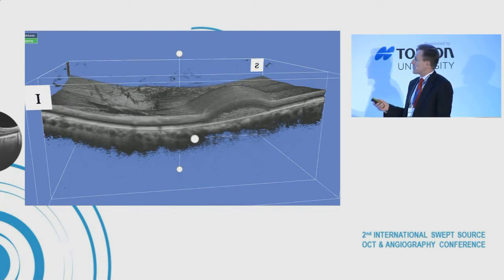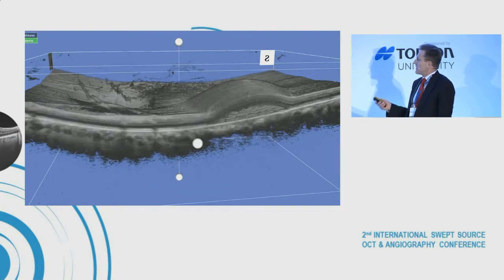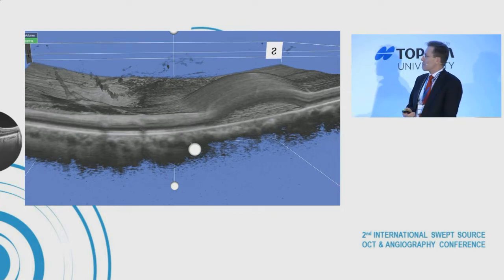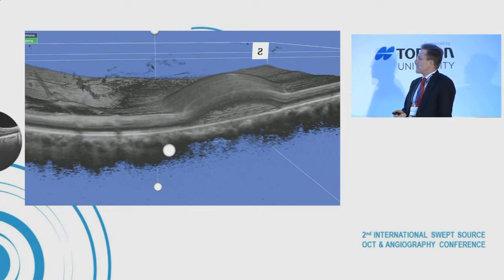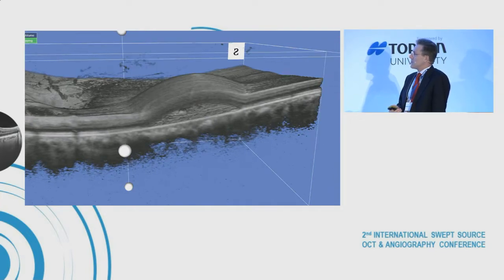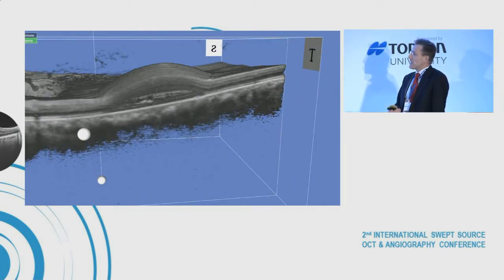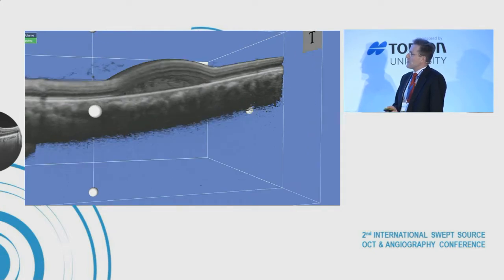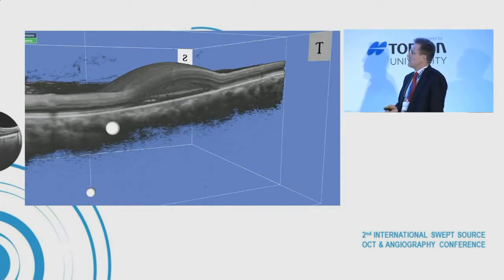Actually, it's from the feet, I believe. We can move in, look at the bottom of this cavity, and see that it's cobbled because of all the debris from the photoreceptors. We can shift it, and we can twist and turn it so that we see the floor or the roof as we have it here.